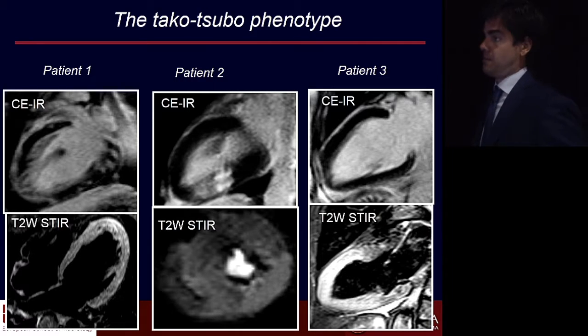What about patient number 3? Do you see late enhancement? Who votes for yes? One colleague or 2 colleagues say you see late enhancement. Where would you notice it? I think the signal here looks quite homogeneous. This is a 2-chamber view without clear evidence of late enhancement. But the second line is more important. What's going on here? Edema.